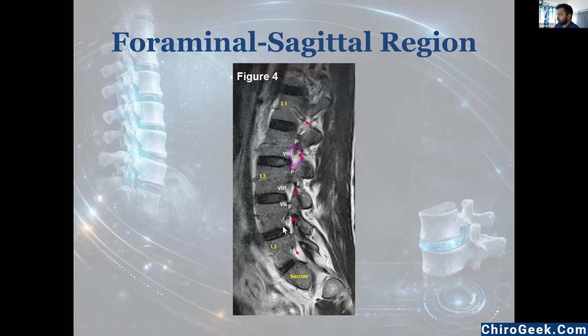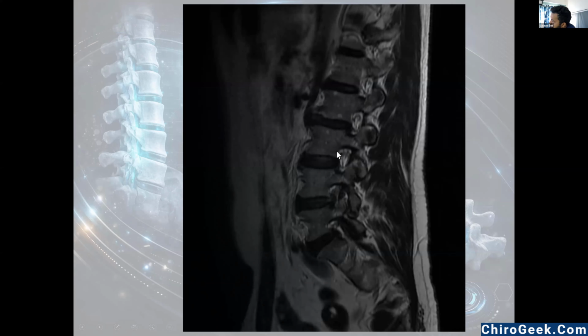If there is any paracentral bulge or foraminal bulge which is compressing, you can see here. Here you can see all the foramens are nicely visible. But in this area, the foramen is not nicely visible. Here the disc is bulging out and compressing the foramen. So this is the foraminal bulge. The patient will have excruciating pain because the dorsal root ganglion is located over there, which is the house of all sensory fibers. So it will cause severe pain.